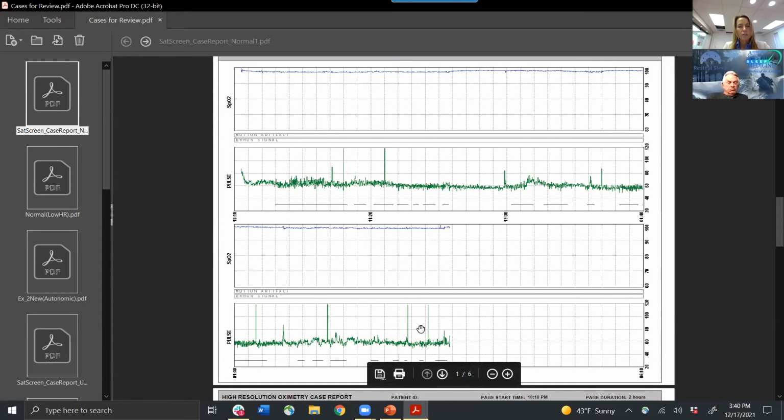We'll notice in this particular study, you see a couple of just high pops here. That's actually artifacts that we're typically looking at. When you see this very, very quick change, it's called pulse channel popping, where you see a quick increase over a matter of a second to 120 and back down or something close to that. That's typically not physiologically possible.